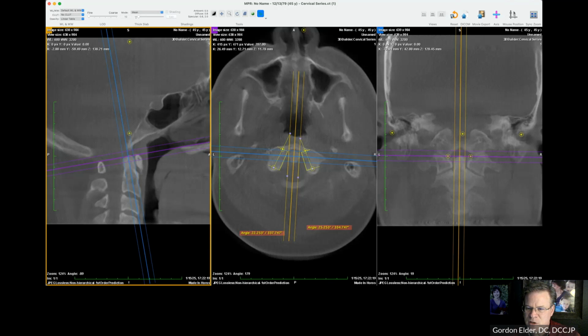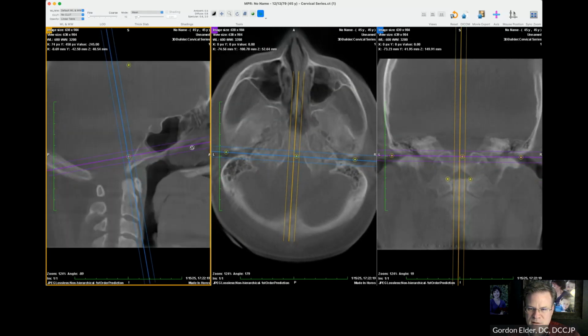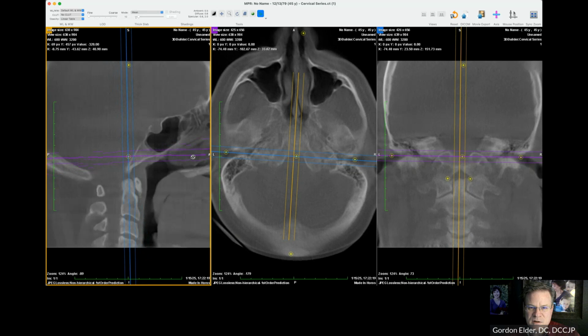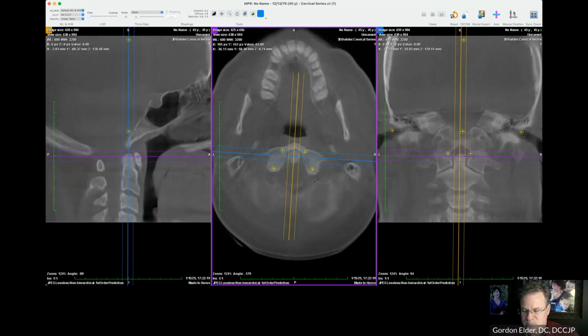And what we want to do is look at this lateral margin parallel to this convergence angle. And I'm going to want to measure it as well. So if I'm going to measure it, then I need to reset the program so that I'm measuring it towards the ground. So now we're reset towards the ground. We can go back down. We can see my dots still there. See, now all my lines have disappeared. Not all programs work that way, so you don't have to do that for everyone, but this one particularly does.